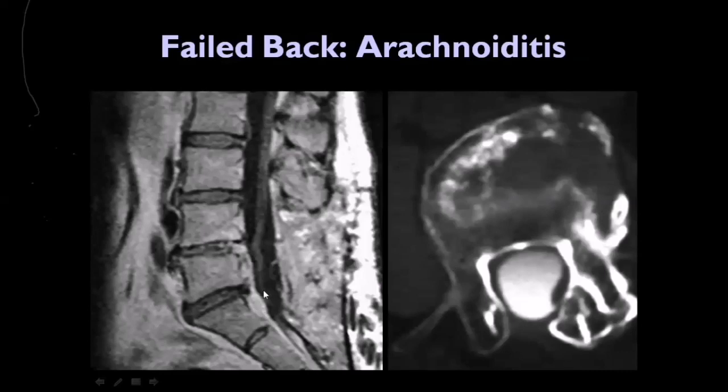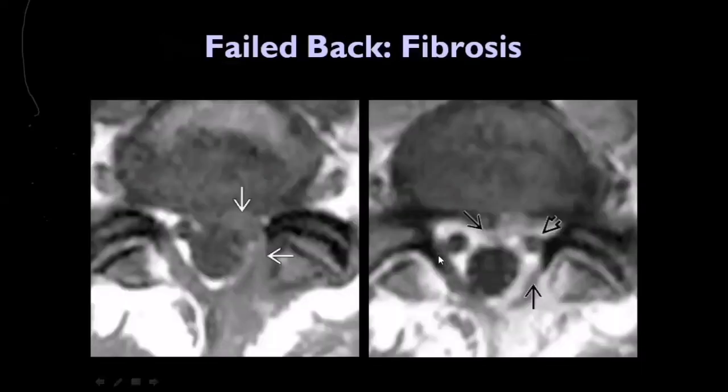When you see this, please ask about operation, especially if you have a defective lamina. Here you don't see any lamina. So this patient, you already have something in the image telling you that he had an operation. So be careful in this case not to rush and say just herniation or something like disc extrusion. No, okay.